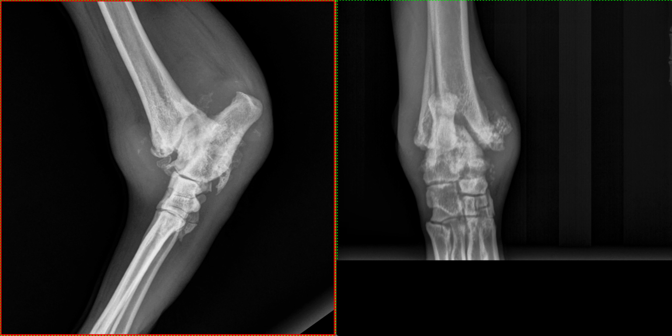The left tarsus indicates severe joint effusion and periarticular swelling. We have chronic subluxation of the tibiotarsal joint, which may be secondary to historical OCD of the talus, or may be associated with previous trauma. The osseous changes are compatible with chronic arthritis as well as concurrent septic arthritis. Possible popliteal lymph node enlargement is bilateral and may represent reactive hyperplasia. There is mild right tarsal osteoarthrosis.